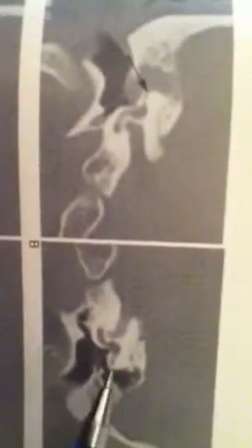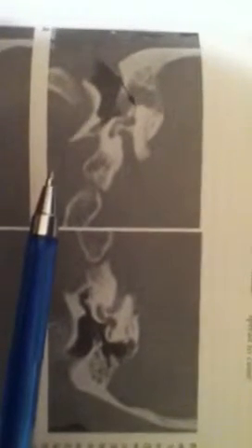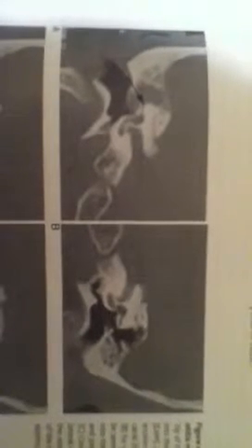So mass erosion, destruction of the ossicles, replacement of the normal lower attenuation picture because of air by a soft tissue attenuation. These point towards presence of otitis media, and this should be correlated with clinical findings, which is usually ear pain, ear discharge, which is most commonly purulent, bloody discharge.